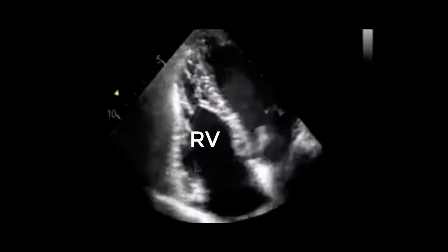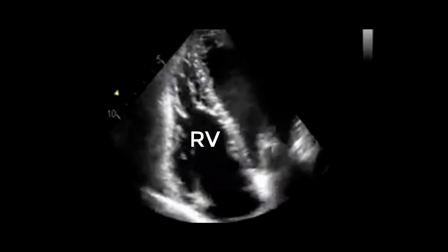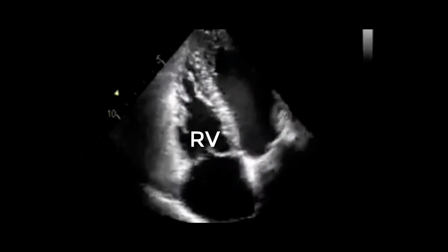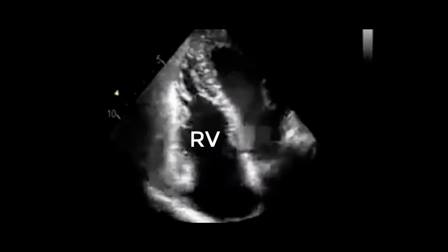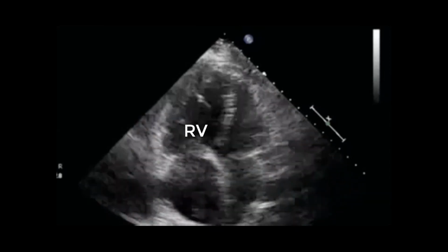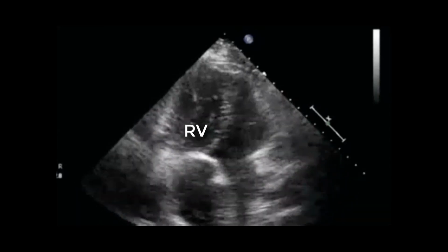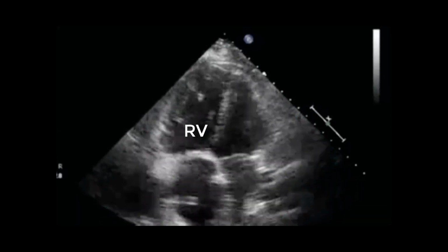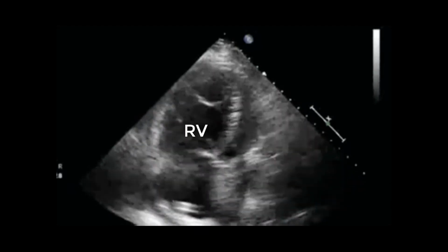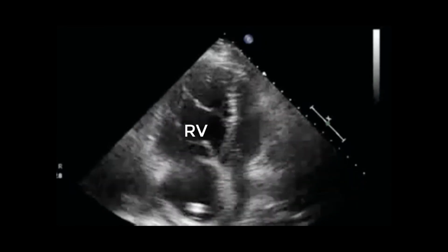In the four-chamber apical view, we can evaluate the RV for any signs of enlargement. This is a normal RV in the four-chamber apical view. Now compare this to an enlarged RV with RV failure. In the shock patient, it must be considered to be either a large RV infarct or more likely a massive PE. From a qualitative standpoint, the RV should be smaller than the size of the LV and should raise concern if the RV is greater than the size of the LV.